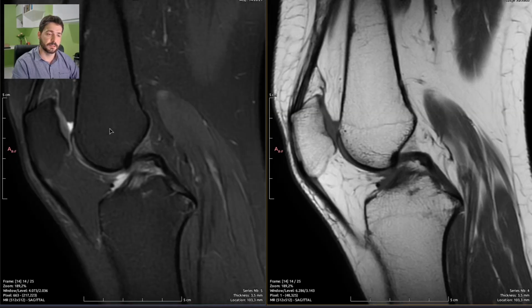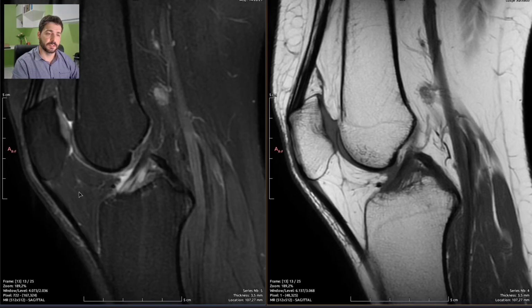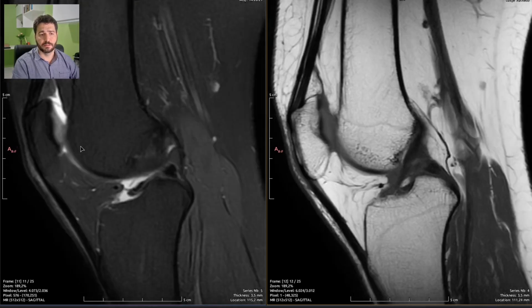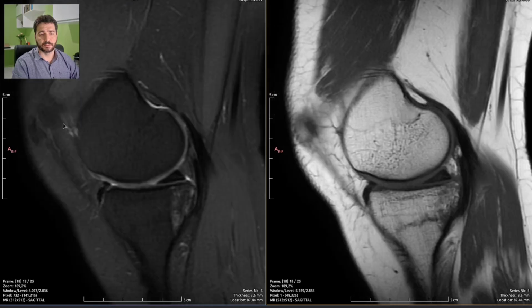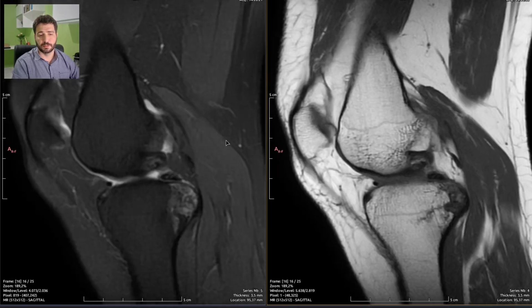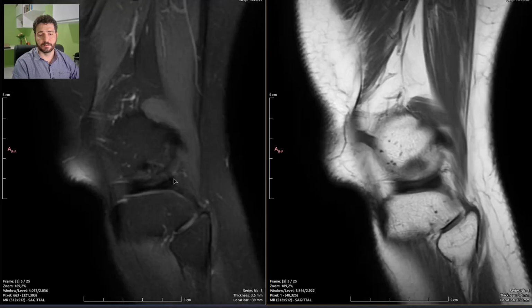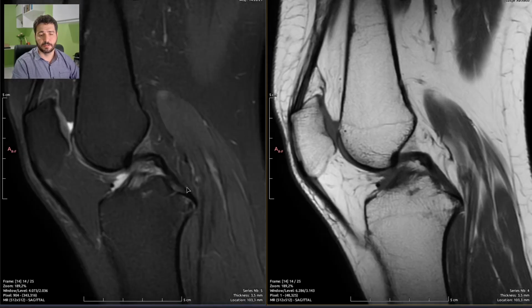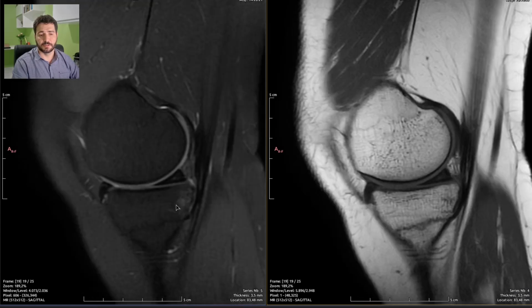It makes sense. There is, as always, a tiny inflammation of the proximal extremity of the patellar tendon. Patellar cartilage seems fine. Cartilage is right here. Bone is from the black margin inward. So this is the lateral meniscus. Seems fine. Bow tie appearance is fine.